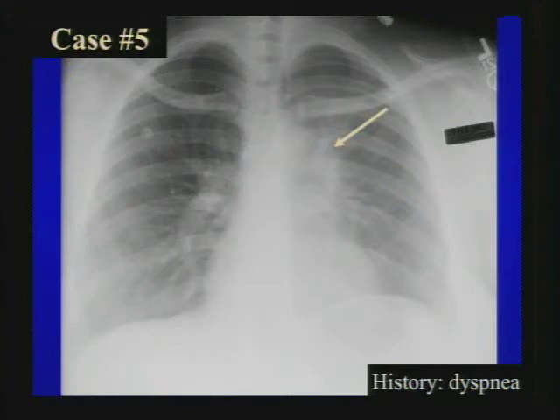Okay, people often misinterpret this as a mass in the hilum. Why does it look like a mass in the hilum? Because the hilum's elevated, and that makes it look larger than it should be. But notice that the diaphragm is also elevated, all right? This sort of hazy, veil-like density with signs of volume loss. When you get collapse in the left upper lobe, you don't see the fissure. Why? Because the fissure just goes directly anteriorly, because there's not a minor fissure in that case, okay?